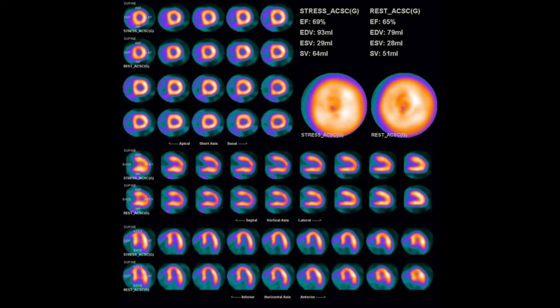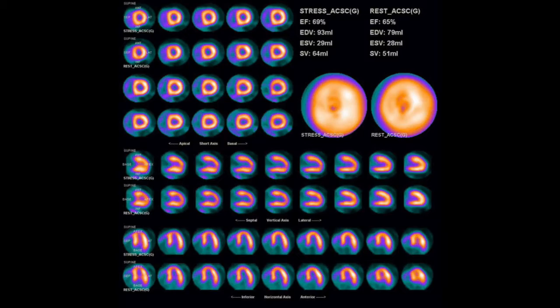So this is the end product of a myocardial perfusion scan, a single display image containing all of the heart in one go, and let me talk you through how this is actually derived and displayed. So you take the heart, orientated along the long axis of the left ventricle, and then slice it up virtually. These are the tomograms. You can cut along the short axis and derive short axis slices, the donut, from apex through to base.